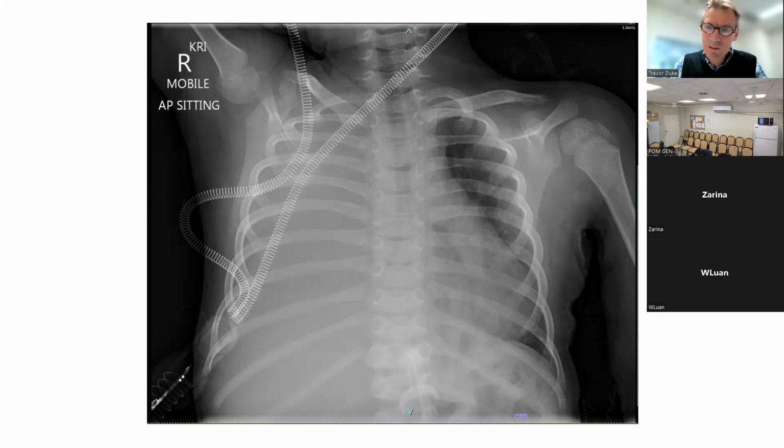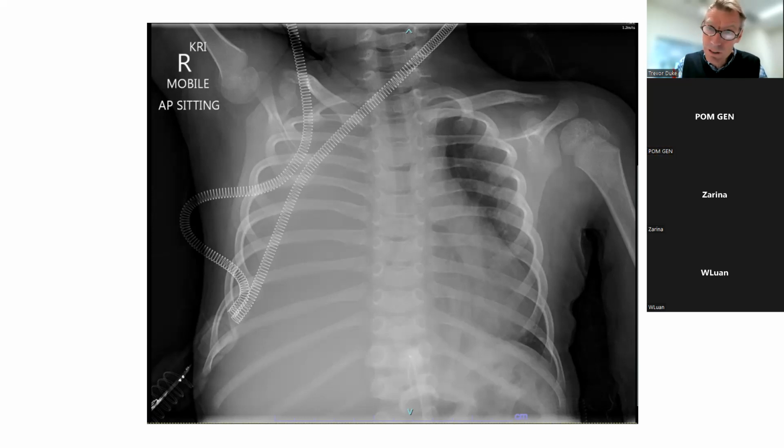But you've jumped a step and said that, well, because there's mediastinal shift to the opposite side, then it's more likely to be fluid or a mass. And you're quite right, because if you've got consolidation or collapse, you're more likely to have the mediastinum in the midline position or shifted to the side of the pathology. So I hope everyone can see that.